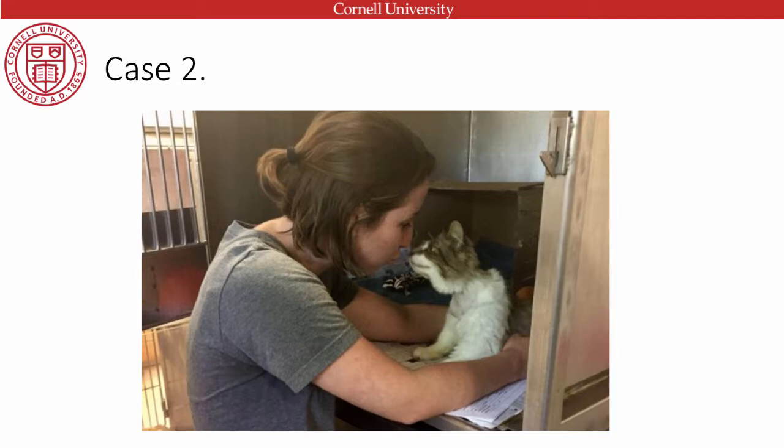Let me just think how they... I think they trimmed the end and went further through, pushed it through, because the tip of the arrow was sitting still within the soft tissue, so they couldn't retract that. So they took the top off and then they very carefully edged it through. Yeah. So it was really helpful. That CT was really, really useful for identifying that. So she did well.